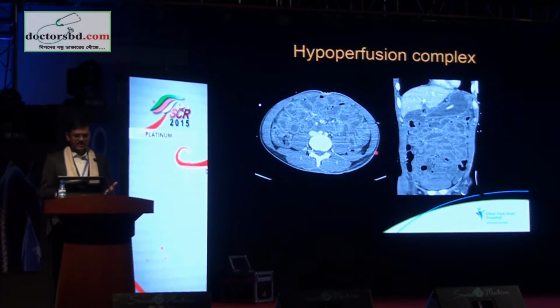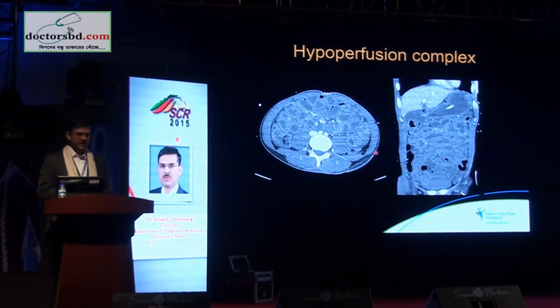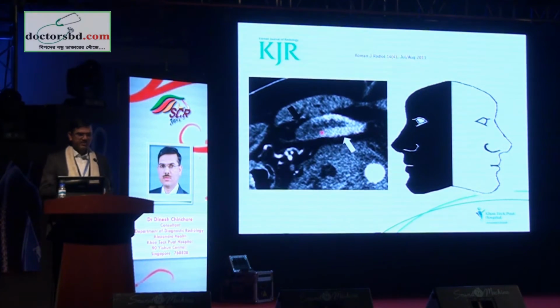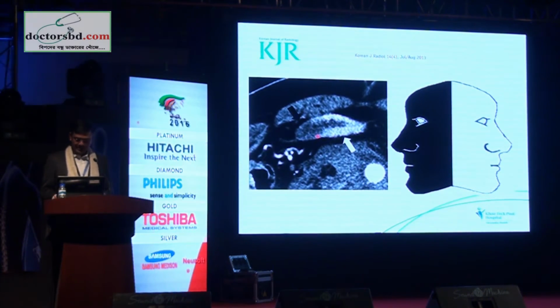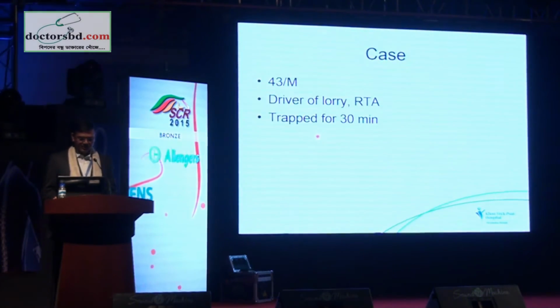Another different increased enhancement could be due to hypoperfusion complex, especially this is because of the interstitial leakage of contrast, a shock bowel. So this is where we need to differentiate. One of the signs described is called a Janus sign. This is named after one of the Greek Roman gods. If you see a bowel loop which enhances vividly, and then there is no enhancement at all, then we should suspect that this is something abnormal. We'll come to a few cases.